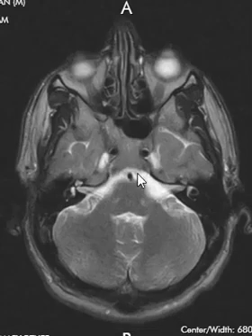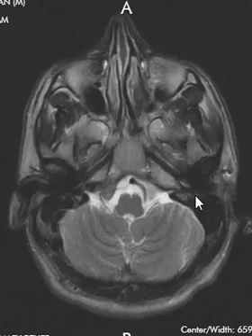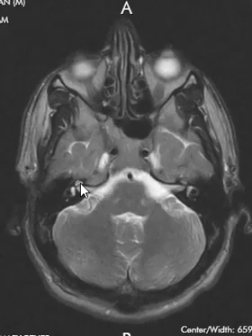Now we're going to go down a little bit further, and we look at these two things. These are called the internal auditory canals. This is the right side, left side. We see these little circles here. These are the semicircular canals. They give balance. And also we have other little things here called the cochlea, this little area here, little area over here. Just going to glance at these and make sure that there is no tumor within this little canal here, the internal auditory canal, and make sure that these structures look morphologically normal.